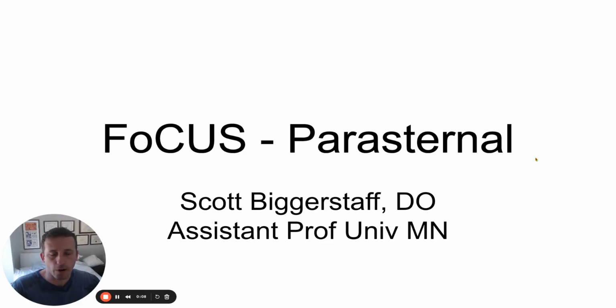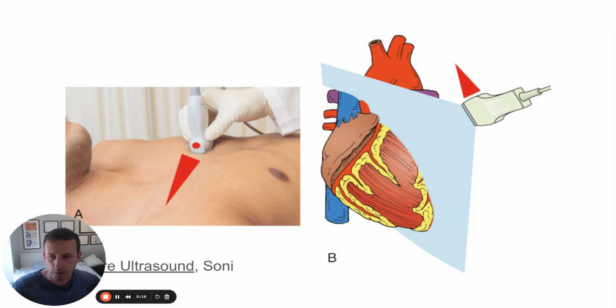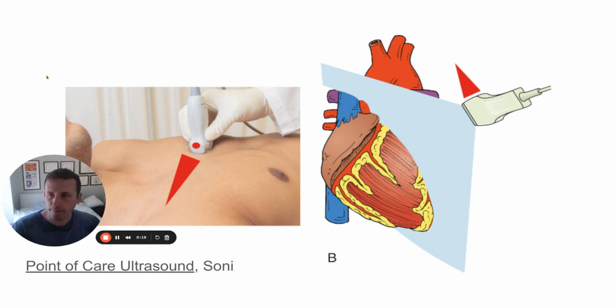Today we're focused on cardiac stuff. We'll start with the parasternal views. Again, shout out to thepocusatlas.com for a lot of images and GIFs. We'll start with the parasternal long axis view.